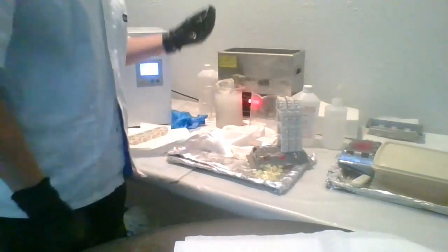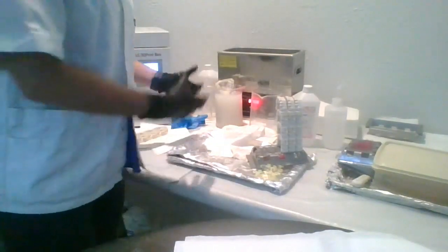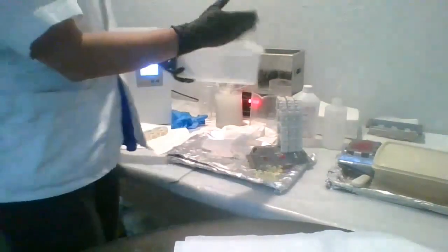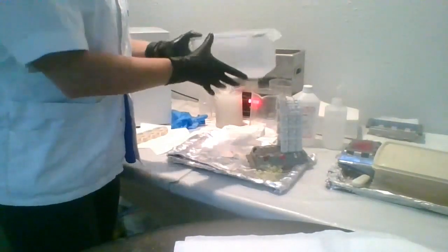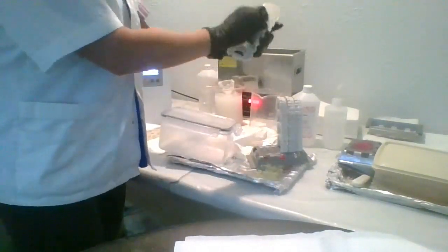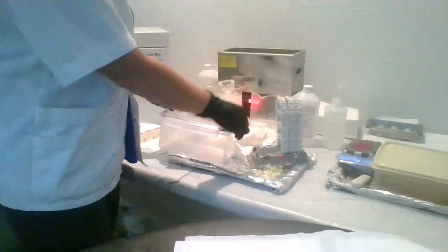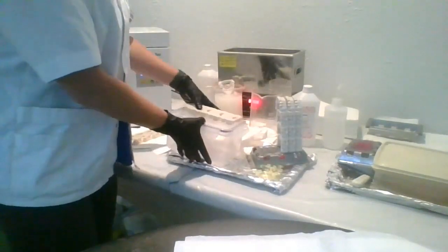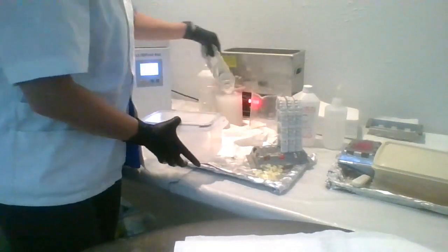After you do the 3 minutes and then the 2 minutes, and again, I also have a container that's really nice to use for these, you're going to flip them the opposite direction because you want all of the material to come out of the cavities. So you can do your 3 minutes, and then flip all of the arches, 2 minutes in your ultrasonic.